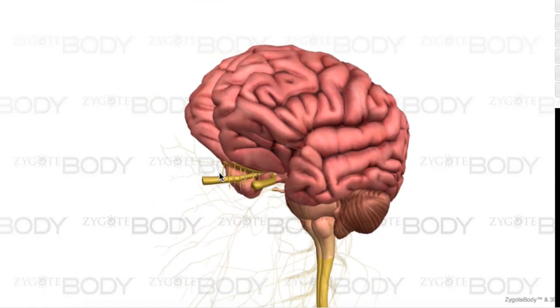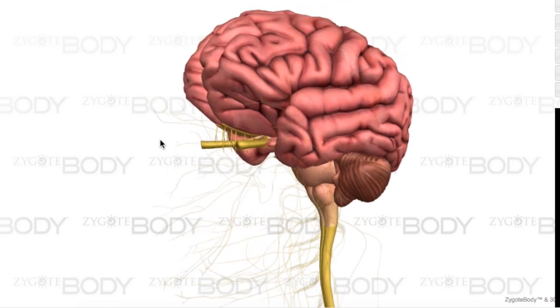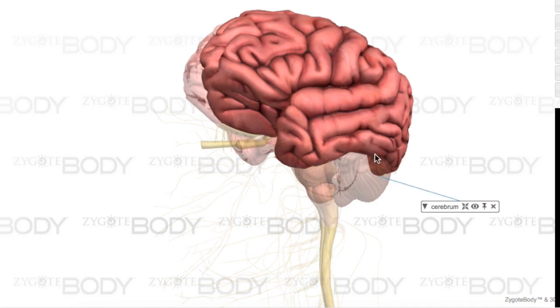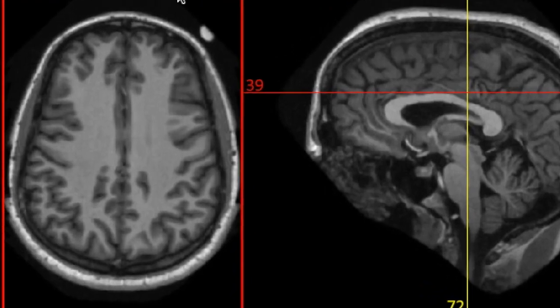If we consider the brain as a whole, neuroanatomy can seem kind of overwhelming, so we're going to simplify it down to smaller parts, and hopefully you'll see that there's this triad of location, structure, and function. First, consider the cerebrum or telencephalon, the actual brain tissue, organized into sulci and gyri, and on a larger scale, organized into lobes, which each carry out their own executive functions. Aside from that, on imaging, it all looks the exact same. It's easily discernible from the structures beneath.